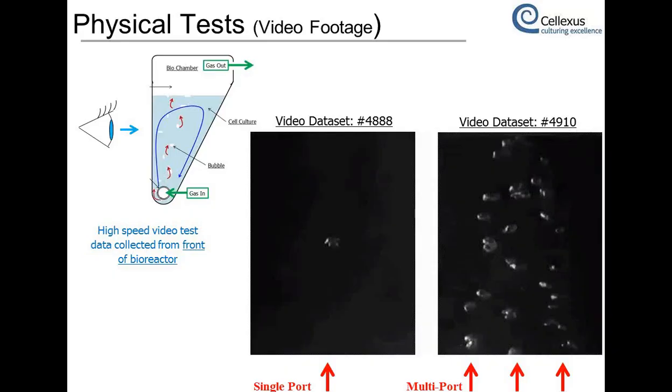And as you could see from the animations earlier, they sort of wobble as they're going up and they change shape. So as it was coming out, we assessed the area in 2 dimensions, and then we found an equivalent circular diameter. In addition to that, we found the aspect ratio, which is the longest length over the shortest length, and assessed that over time.